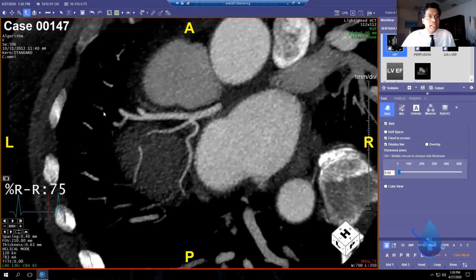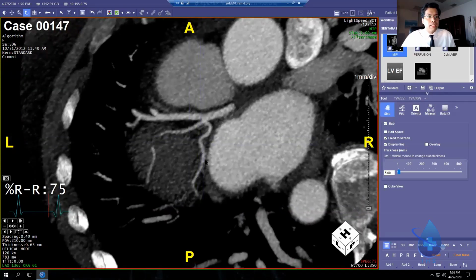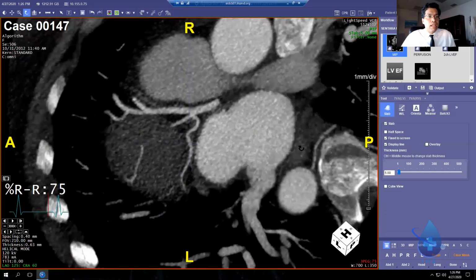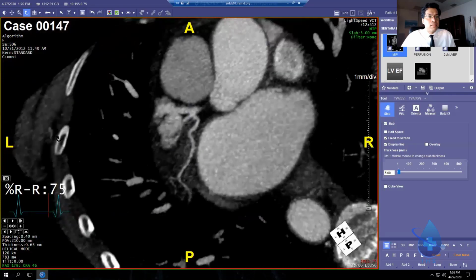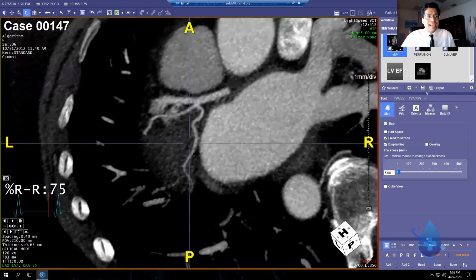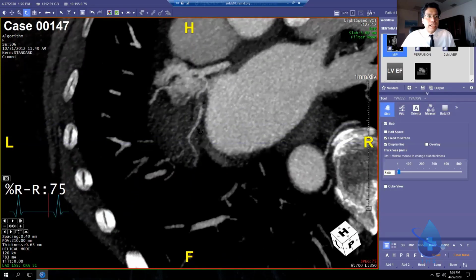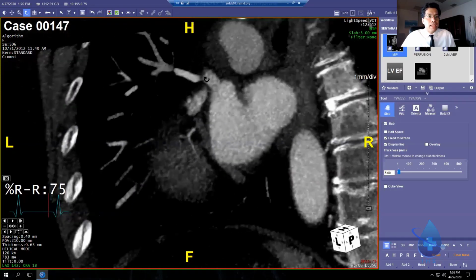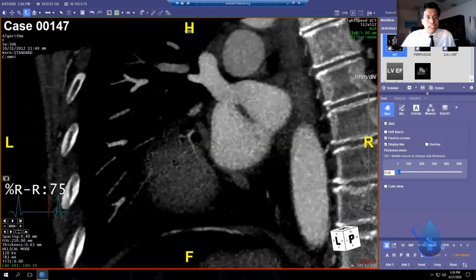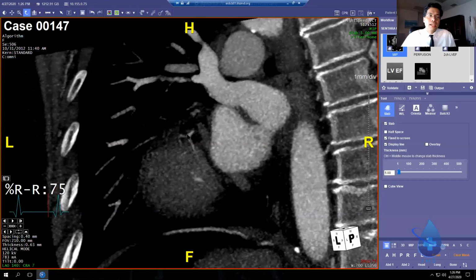So now the LAD is going across the blue line here, and the circ is here. So we move left and right, looking for any lesion. And this is a small, piddly, non-dominant circ, so we're not going to care too much about it. Right here, you'll say, Bhasin, are we going to call that normal? Yeah, we're going to call that normal, because that's as normal as it gets by cardiac CT on a 64-slice scan. There's no engaged catheter. There's a slice line artifact cutting across here.